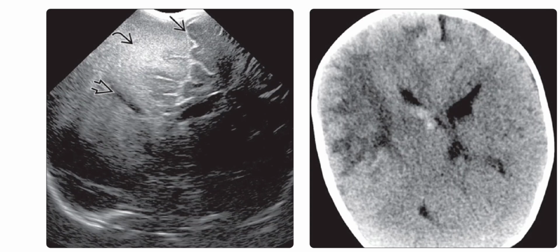On the left is the coronal ultrasound image in a newborn with seizures, and it shows an enlarged right hemisphere with hyperechoic white matter and an abnormally pointed right frontal horn. The interhemispheric fissure is displaced across the midline.